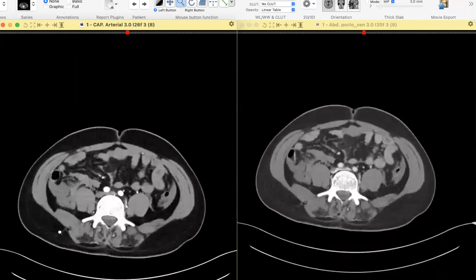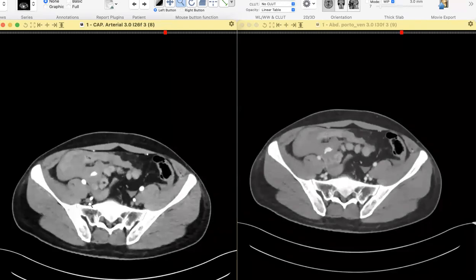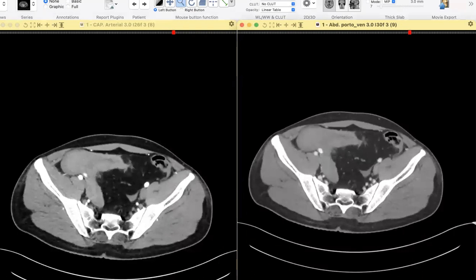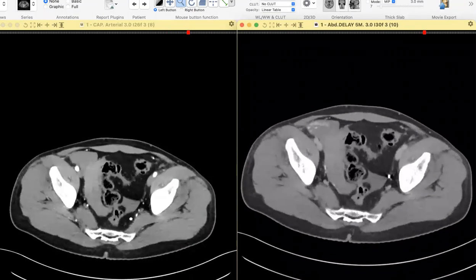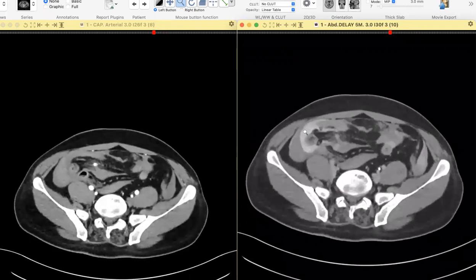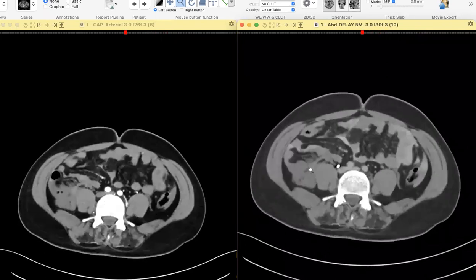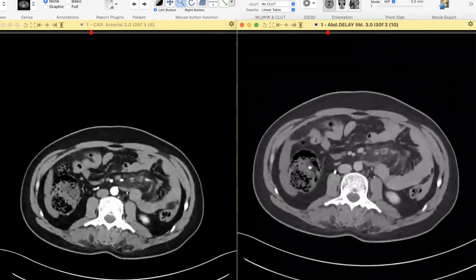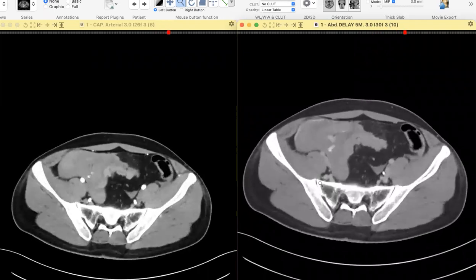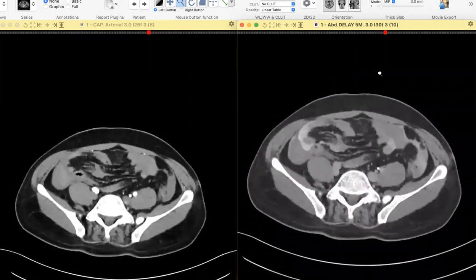Yeah. And you have to speak in continuation. So in arterial, there is a blush, and in venous, there is continued increase in the size of the blush. And then I would also ask for the delayed in this case, and in delayed, it becomes much more obvious. And this is all extravasated contrast now that we have, which we are beginning to see as layered. So they took this patient directly from the CT room to the operation theater, and luckily they saved his life.